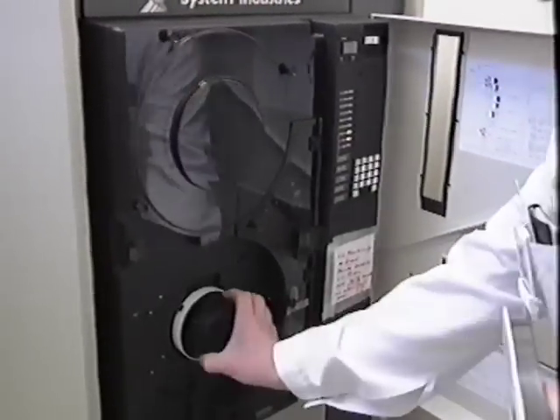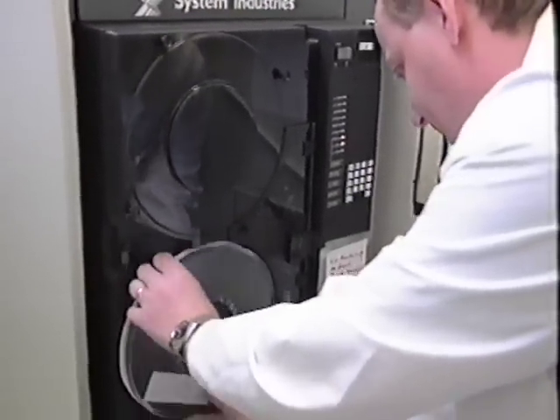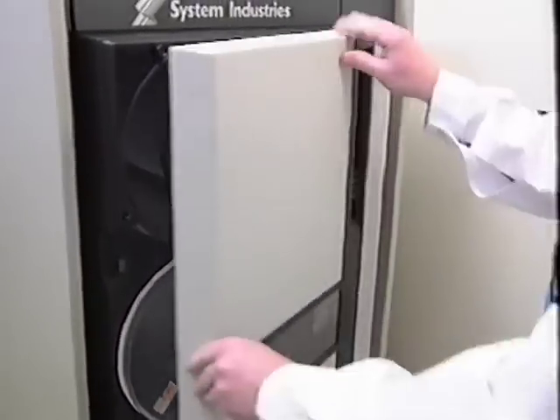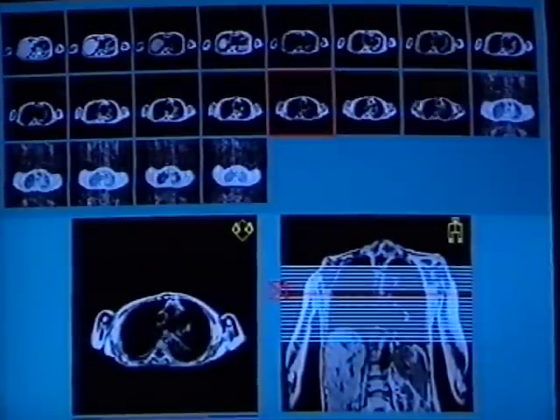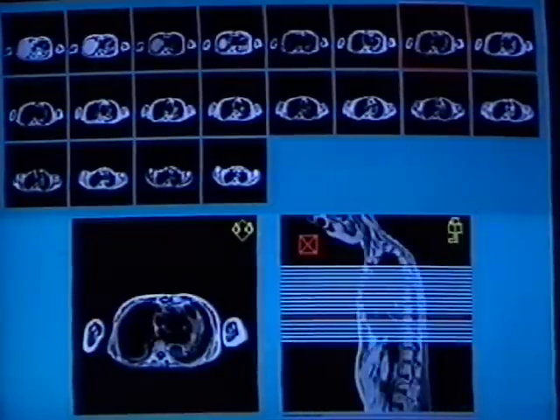The images are read into TMS via magnetic tapes or directly via connections to available PACS nets. Before the images are stored in the TMS database, they are investigated to remove bad images.